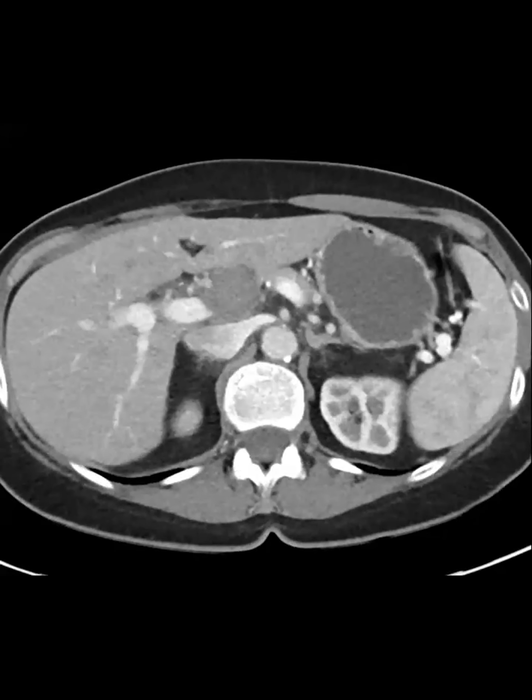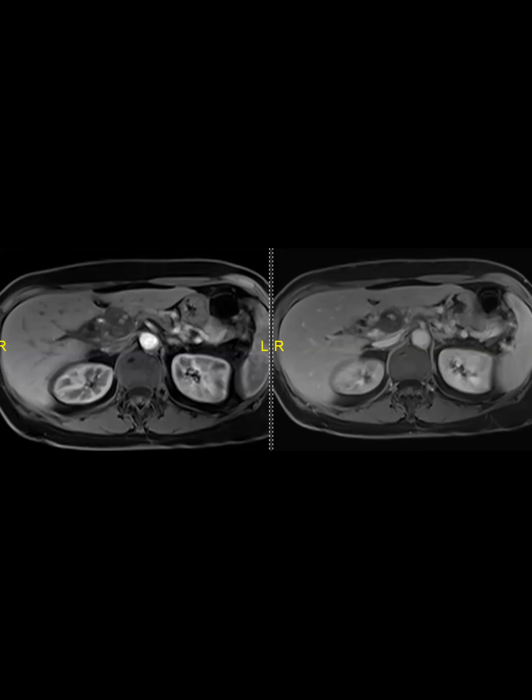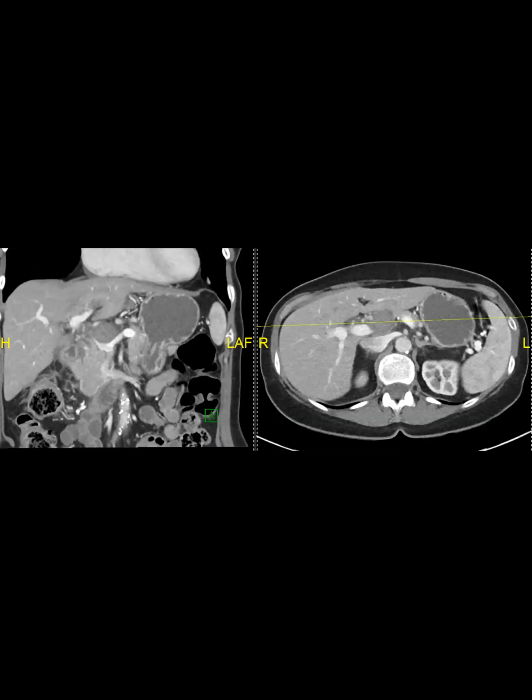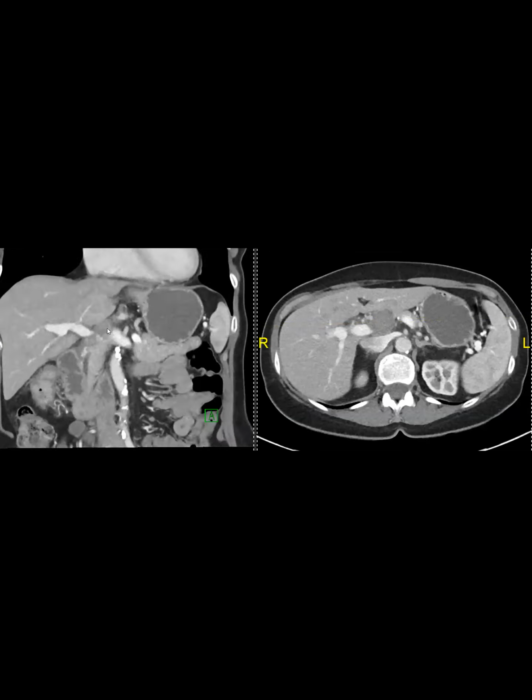The pancreas looks okay. There's no ductal dilation. The parenchyma is fine. Can I see that in a coronal, the CT or MR? I want to see if it's arising from the pancreas. Okay, hold on. Archie, just in case, can you pause the recording for a second? Okay, go ahead. So you can see here, that's the lesion.